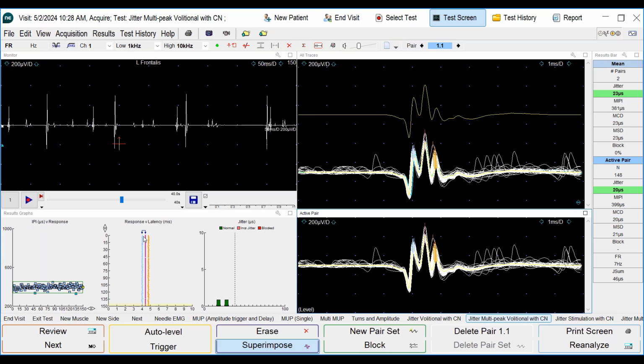That corresponds to the blue dots over here. And that corresponds to the blue squares over here. So there's a lot of color coordination involved in this because we may get 4 or 5 different spikes that are time locked, and it would be very confusing on which jitter analysis we are conducting. If I wanted to select this spike over here, I will simply click with the left mouse. Notice the change in the arrows, and we got things over here.